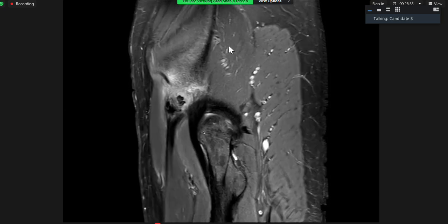So this could be traction trauma. Okay. It may cause traction tendinitis and involve edema. There is no history of trauma, but okay, that's a good thought. So we thought, okay, let's do a CT then.